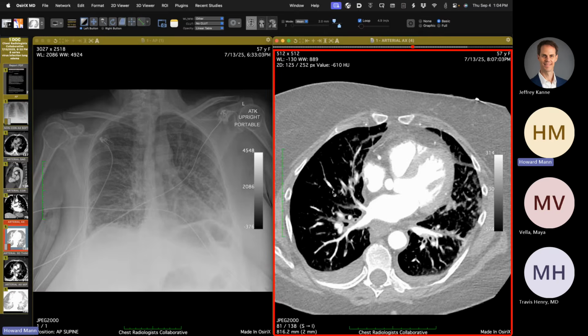So typically, I teach that when you have, and of course it depends on the acuteness of the situation, but if you have florid interstitial lung edema, and you're thinking that this isn't hydrostatic lung edema, then some unusual things should come to mind.